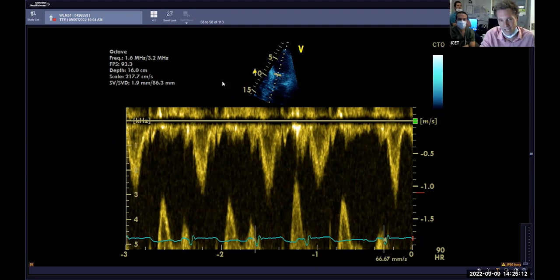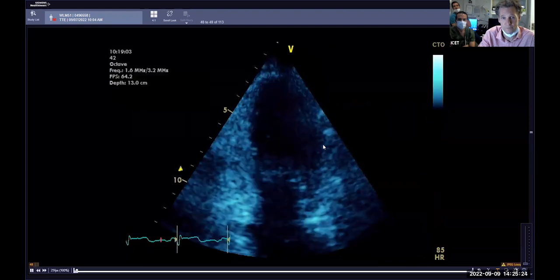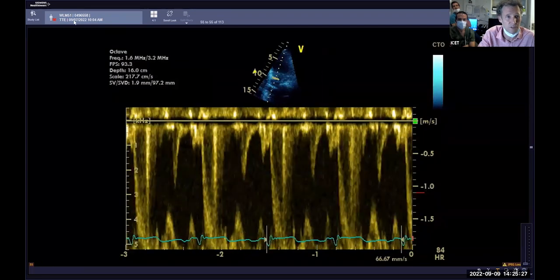And it's only when we get out of the LVOT that we can fit the profile into the maximum gradient you can get with pulsed wave Doppler. Yeah, hunt for the gradient. Very nice. Cool. Any questions on that? Should we move to the next case?